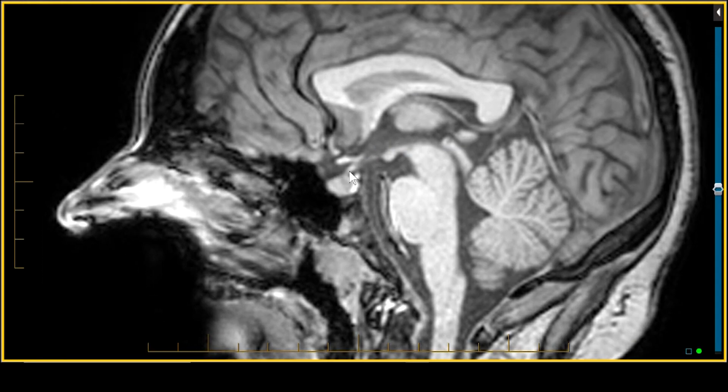And we've also got the suprasellar cistern, and volume averaged is the midline portion of the lateral ventricle. Those are the major cisterns that you see on a sagittal midline view, Pomerantz out.